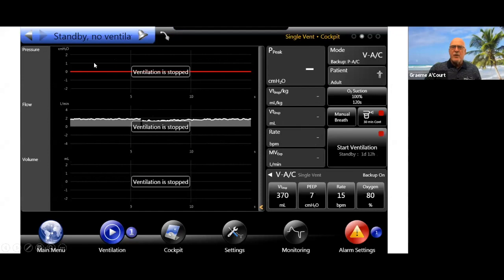Okay, so on the Bellavista, you can configure over here whatever you want to configure. This can be built up to whatever you want to have, and I'll show you later on what you can measure. It's a very powerful package, but this is quite common on all new generation ventilators, that you want specific tailored information. The cockpit or the display should be able to show this of some sorts.